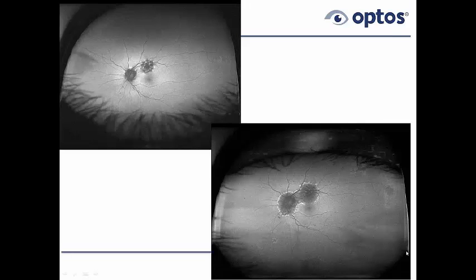But again, generally, it's going to be more central than peripheral. The fovea may be spared, as in this case, but some of these cases will eventually lead to abnormalities in the far periphery. But I think of the series that we looked at, the 300, there are only 3 or 4 that really had dramatic abnormalities in the far peripheral retina. So that would be 1 out of 100 or so.